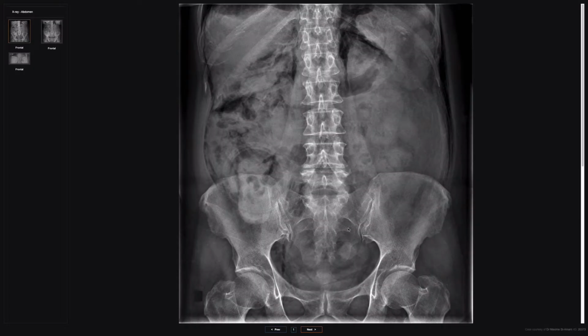All right, now we've talked about air in the peritoneal space. Remember that in the abdomen you've also got the retroperitoneal or the extraperitoneal compartments. And air in those spaces looks very different, because unlike the peritoneal space, which can open up like a balloon, remember that the retroperitoneal and extraperitoneal tissues are tightly bound by fascial planes and lots of different types of tissue.